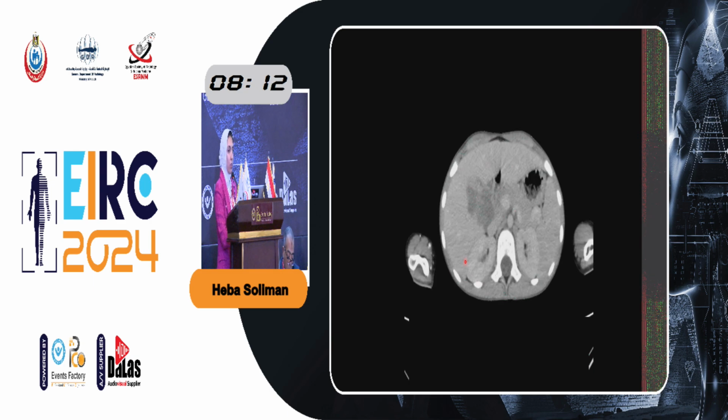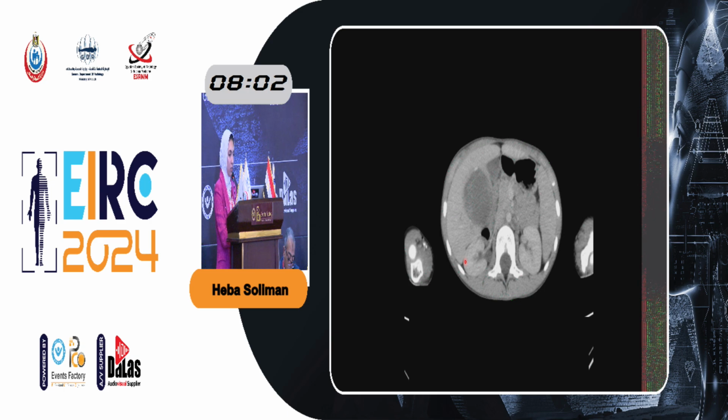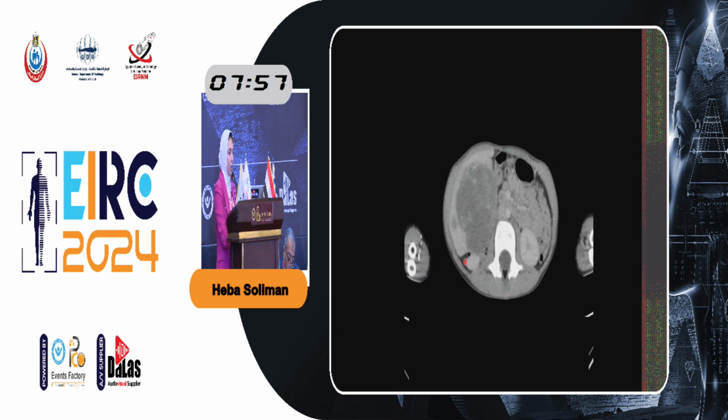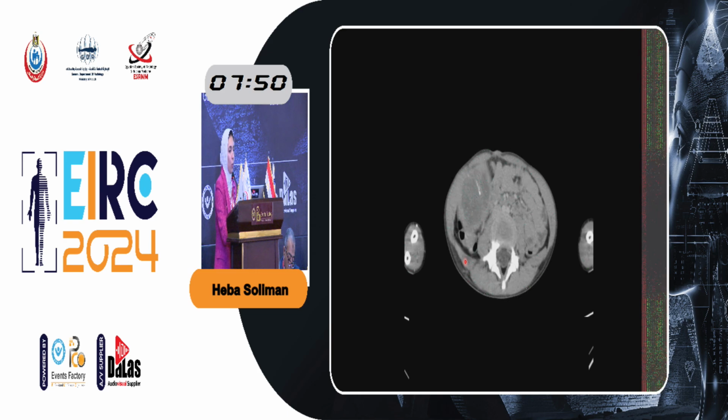This is a case from Burj Al Arab Pediatric Oncology Center. This is a 7-year-old girl presenting with an incidentally discovered liver mass on ultrasound. A contrast-enhanced multiphasic CT of the liver was performed, showing a complex cystic mass with a predominant cystic component and a soft tissue component. The first differential for this case was hydatid disease, which was excluded by serologic study and by a core biopsy that revealed neoplastic tissue.